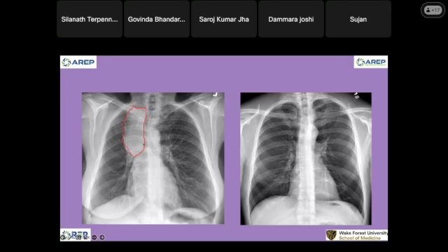So it's a big mass with extrinsic pressure effect to the right trachea, right paratracheal, and tracheobronchial to upper hilum. So an example of thyroid cancer, and this one is normal. This one you should see a nice thin looking paratracheal stripe, not a big mass like this.